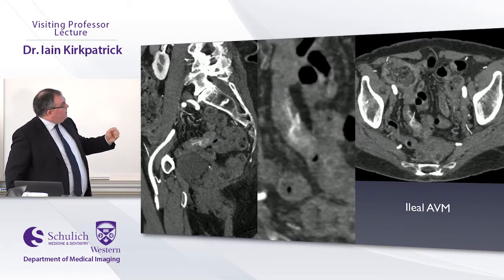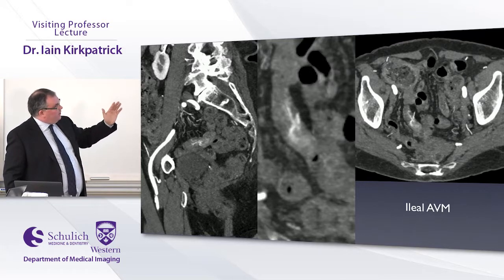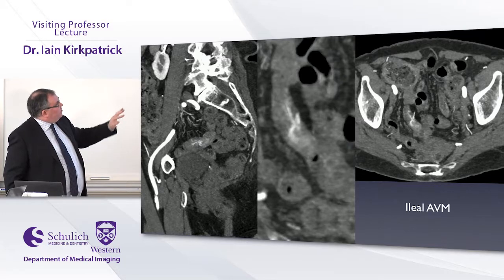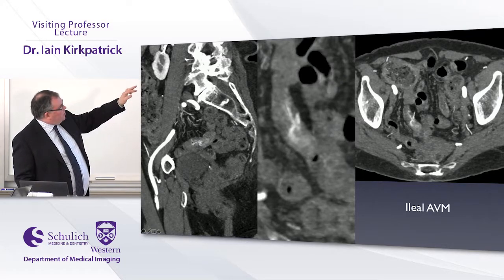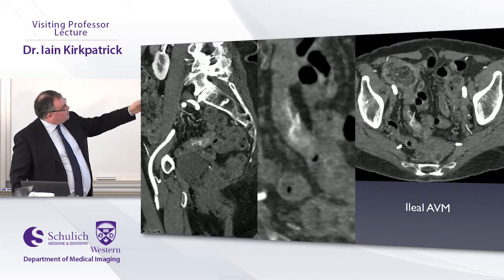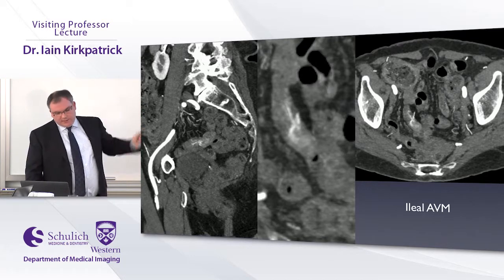The AVMs are often a little bit easier to tell that it really is a vascular lesion because they often have a feeding vessel and a draining vein that you can identify, especially if you do some reformation. So here I just did a thin section MIP so you can appreciate that there's a tangle of vessels there that makes it a lot easier to find. This was actually from the arterial phase of a multi-phase enterography, although I still saw this on the enteric phase.